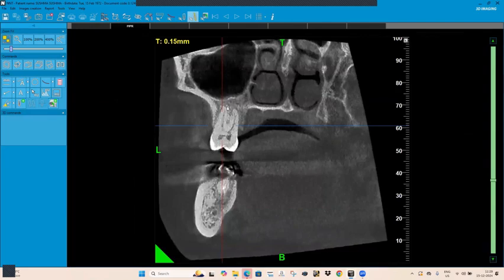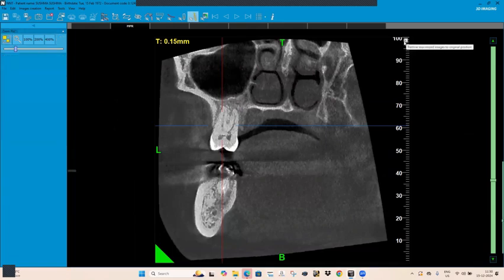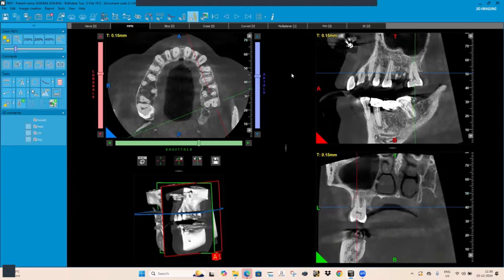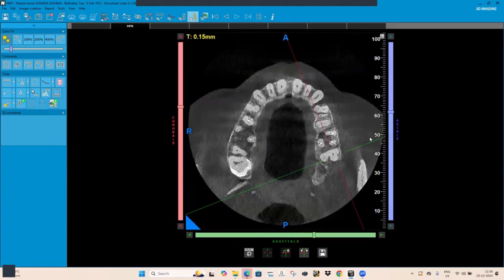From the coronal pulp chamber till the apex, one single canal is going in the mesiobuccal root as well as in the palatal root. So it is Vertucci type 1 in each root, because we give the Vertucci classification for each root. And for the distobuccal, first let me locate it.